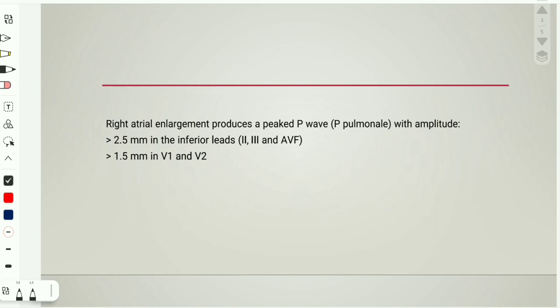for the P wave, they are best seen in lead 2, 3, aVF, like basically two places where you can see this P wave, that's the right atrial enlargement, specifically lead 2 and lead V1. You can also appreciate it in 3 and aVF. But then I don't want to bore us with too much.